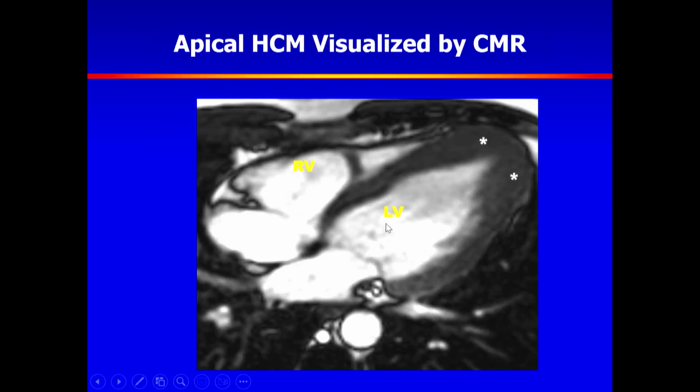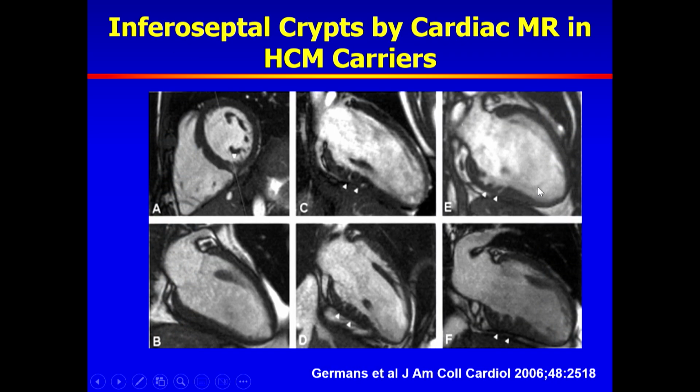Dr. Mann will get into that. There is apical hypertrophy by CMR.